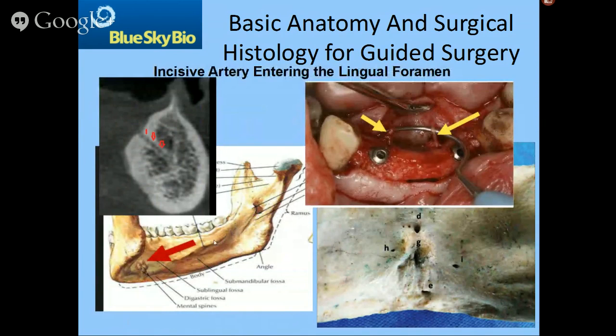the way is right here. I don't know if you can see it. There's an outline right here. That's a submandibular fossa, which has a lot of contents you want to stay away from. To go through a full, thorough anatomy understanding of all the contents that are here that you want to stay away from requires a significant amount of knowledge. And I'm not sure it's necessary that the clinician knows what that is, but if you stay away from the edge of the cliff, which is to stay above the submandibular fossa, you will be okay.